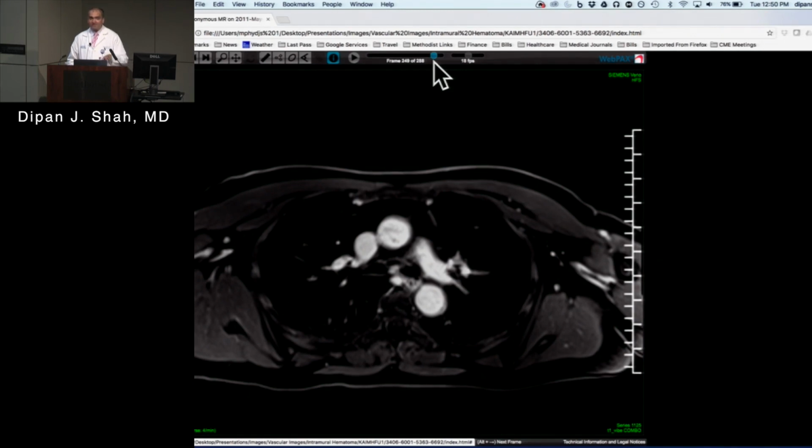Yeah, exactly. That's the thing with these IMHs; they can have significant healing. So I think that there really is a big spectrum between dissection versus an IMH. All right, so let me. Dr. Chang is here. So this second scan here was about 2 months later. Sometimes you see fairly quick evolution just pre-discharge, right? In this person, we didn't have a pre-discharge scan. But oftentimes you'll see a significant increase in the lumen size and a reduction in the IMH size over the course of a week in follow-up.